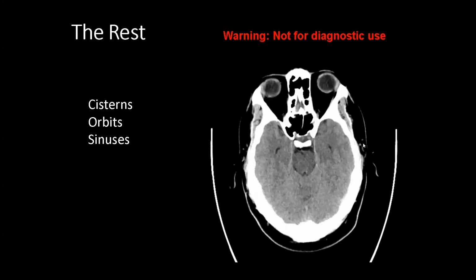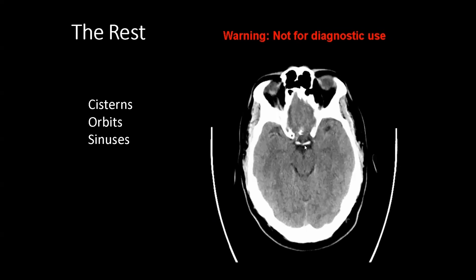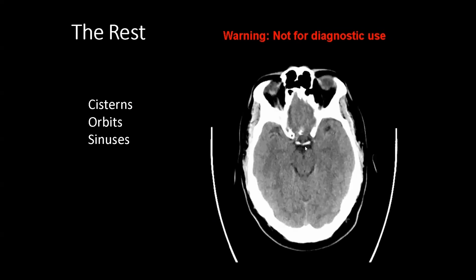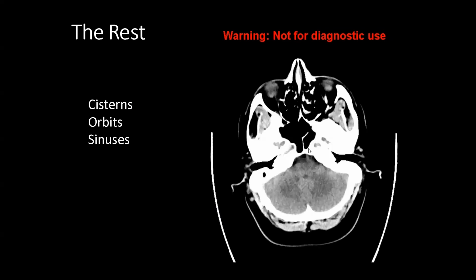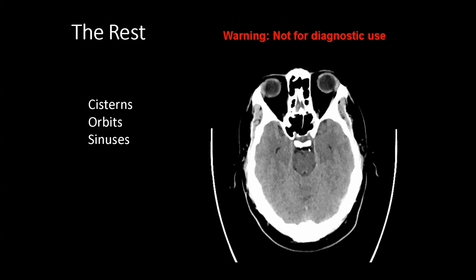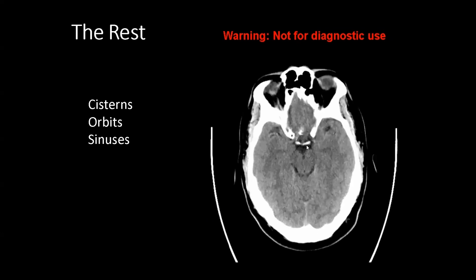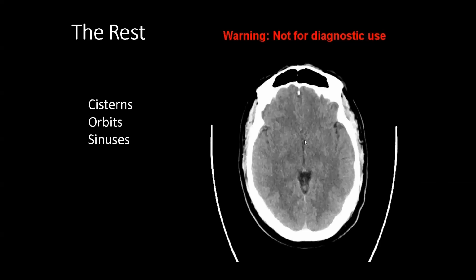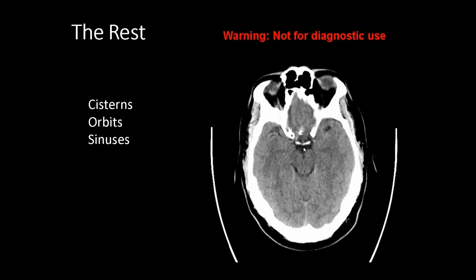So what are the cerebral cisterns? They are really what we just said, these prominent extraaxial CSF containing spaces lining the brain, but that are not within the ventricular system. There are quite a few actually, different basal cisterns in the brain. I don't really want to belabor the point and get into all the detailed anatomy today, but if you're interested, there's the suprasellar cistern here, which is above the sella turcica, which houses your pituitary, which you can't really see very well on axial imaging.